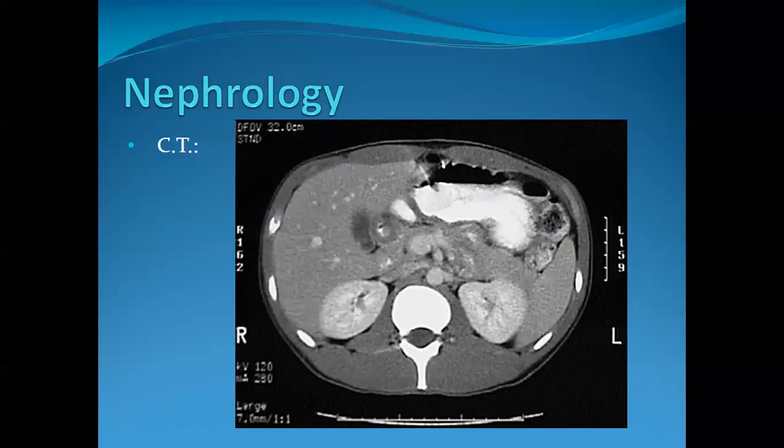One of the things with CT scan that we have to be aware of is when to use contrast and when not to use contrast. If you're really just worried about a renal stone and the potential side effect or complications such as hydronephrosis or things like that, for a renal stone evaluation, contrast is not used, because if you'll notice on this example, this is a CT with contrast.